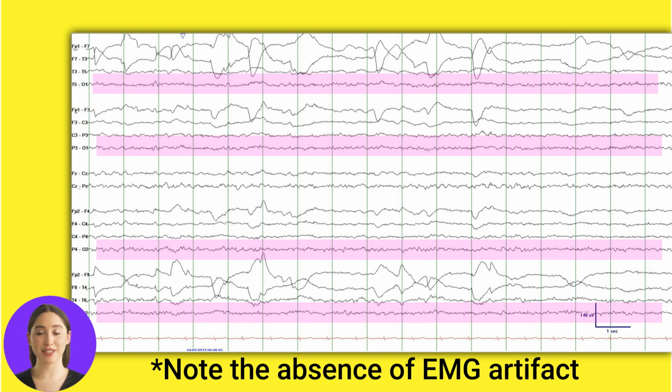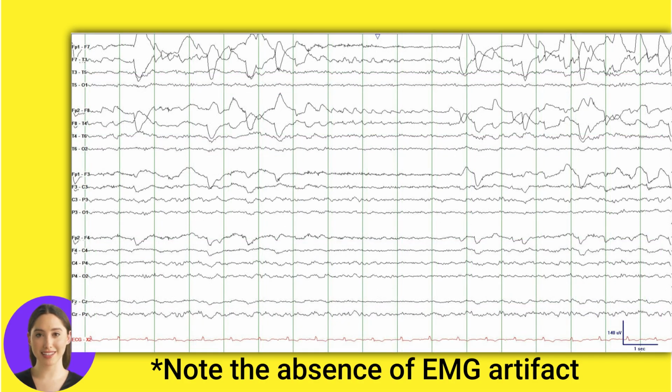Notably, REM sleep includes rhythmic alpha band activity within the posterior regions with a frequency that is close to the patient's awake posterior dominant rhythm, PDR. This can be thought of as a pseudo-PDR. It is attenuated after REM sleep deprivation.